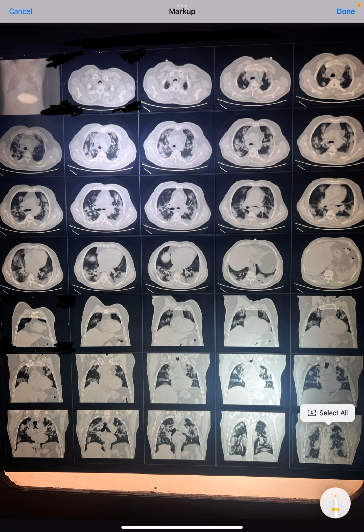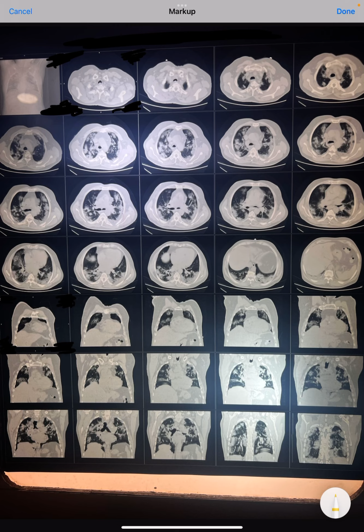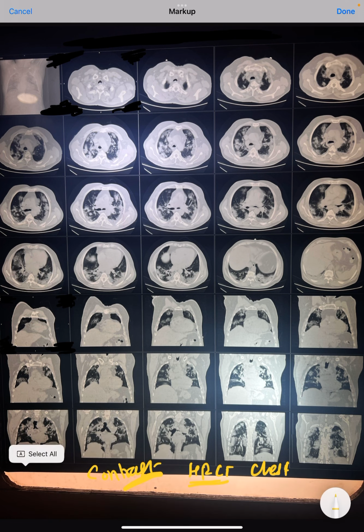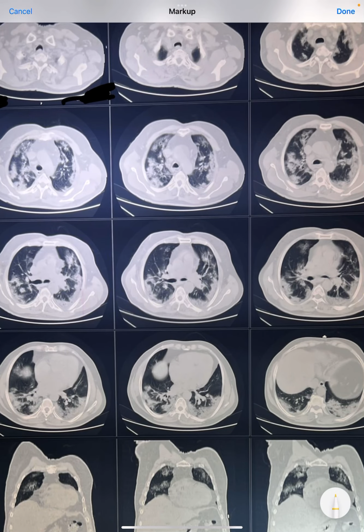So today we'll be talking about a very interesting HRCT chest. Now this is a high resolution CT scan of the chest. Whenever we call it high resolution, it doesn't mean that contrast is used. This is a very common confusion. Whenever someone says that HRCT has to be done, everyone thinks that contrast is used. No, HRCT does not compulsorily mean contrast. This is a without contrast film.